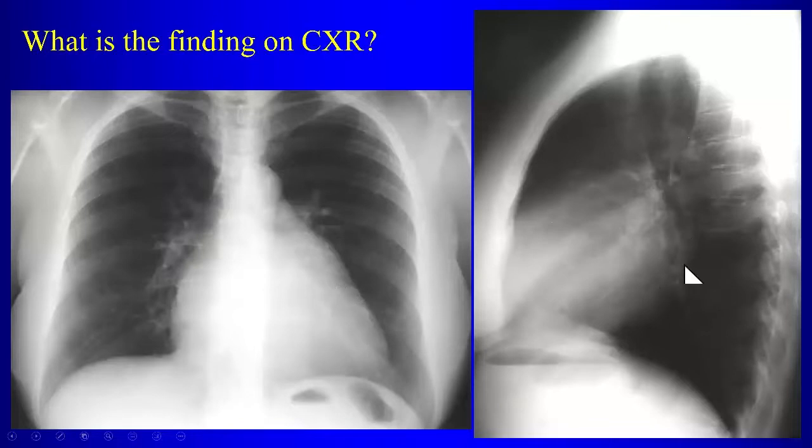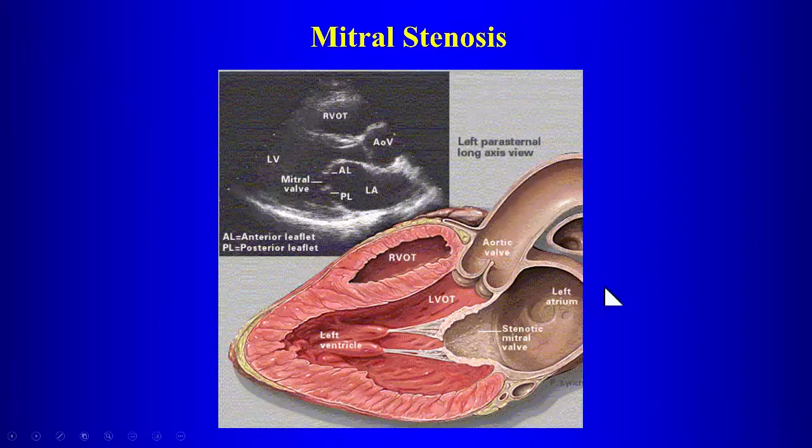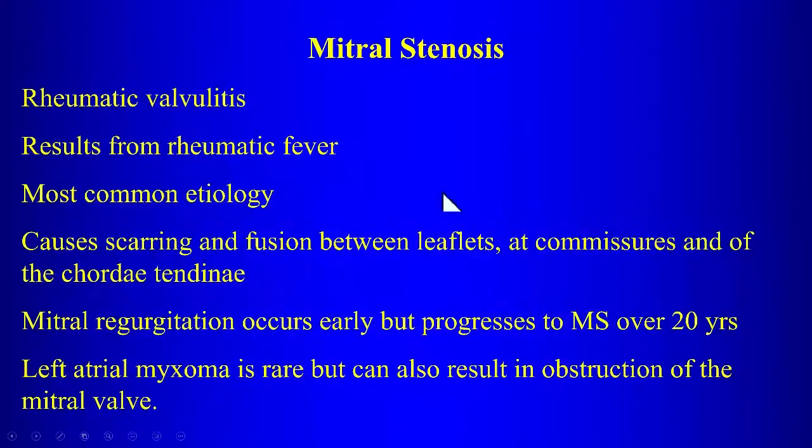The left atrium here is dilated on the lateral view, right? Double density, very subtle in this case, but there it is behind the right atrial border, right? So those are signs of left atrial enlargement. So you would think about problems with the left atrium, rheumatic heart disease, mitral stenosis. Also, atrial fibrillation. Atrial fibrillation can also give you a similar appearance, so that's something else to also consider. So mitral stenosis, usually from rheumatic heart disease.